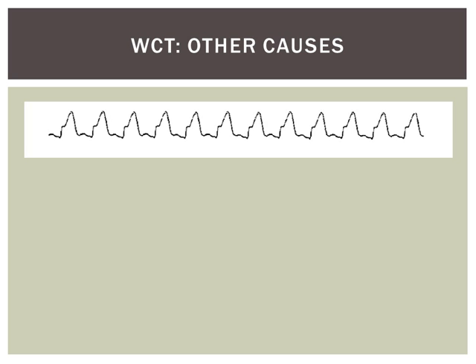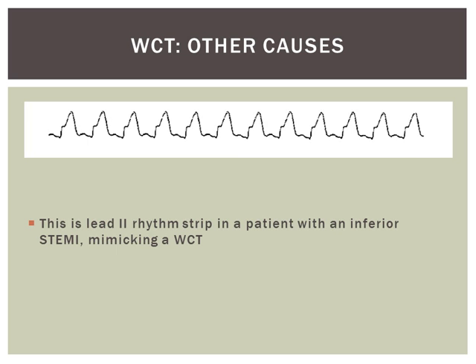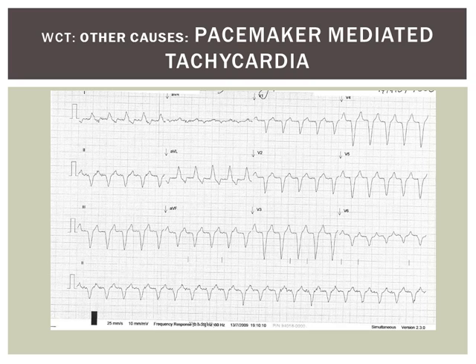What about this one? This isn't particularly fast. It looks a bit like that hyperkalemia ECG we saw earlier, didn't it? This was sometimes being mislabeled as a wide complex tachycardia, but in fact, this is a lead 2 printing out from a rhythm strip, and it's an inferior STEMI with massive ST elevation.